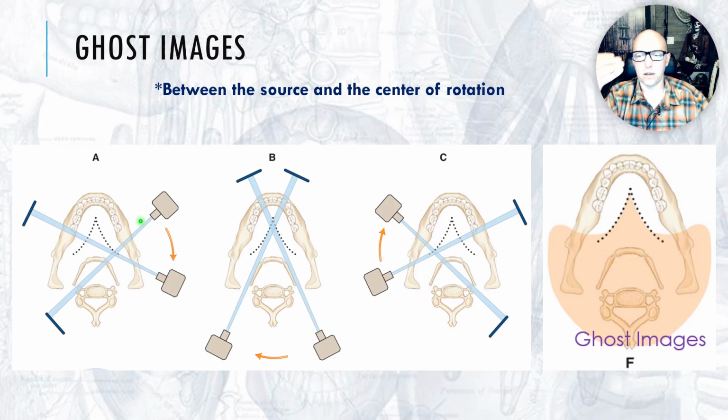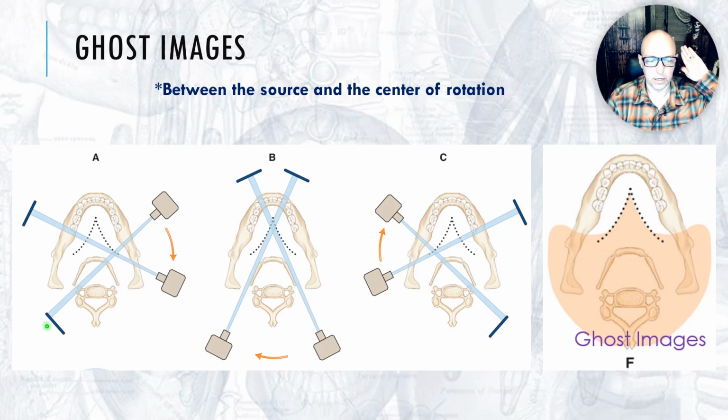It starts with the X-ray source in front of a patient, kind of coming back like this, and the sensor is behind the patient on this side. And they're imaging the left side. So they're imaging the side where the sensor is closer to. So that's what it's showing right here. This is the sensor. And so this is how it starts, and it starts rotating around.